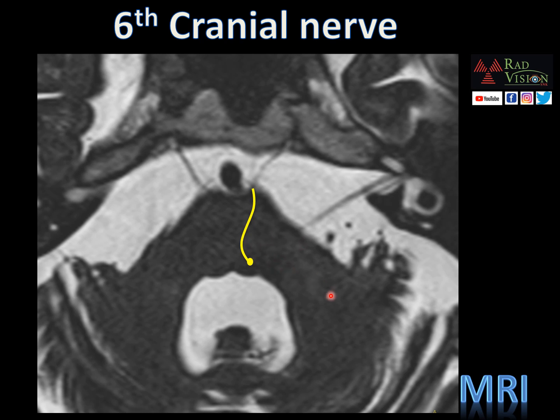This is how the 6th cranial nerve courses internally. So when you see any lesions within the brainstem in 6th cranial nerve palsy, one need to search from this place. This is followed by a cisternal segment. This is how it courses. Further, it goes as a cisternal segment.